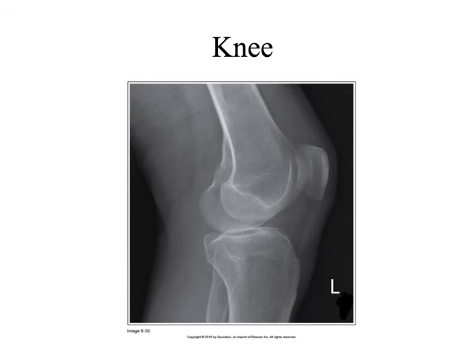Okay, lateral. Is this a good lateral? No. What are some of the criteria that we're looking for to determine if we've got a good lateral in the X-ray? You see a joint space between the patella and the femur. Femoral condyles are... What do we call this joint here?